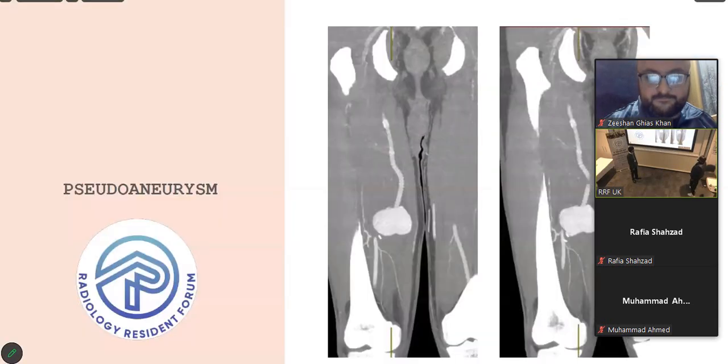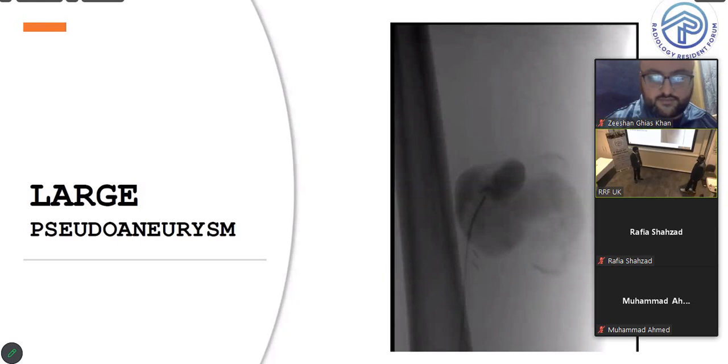These are a few scans that we saw with the obturator graft feeding into a massive pseudoaneurysm. You can see the native popliteal artery with collateral branches given off. Post-imaging during the procedure, they injected via a retrograde approach, and we saw a massive pseudoaneurysm just above the popliteal level. And what we saw distal to this is that we couldn't see anything related.